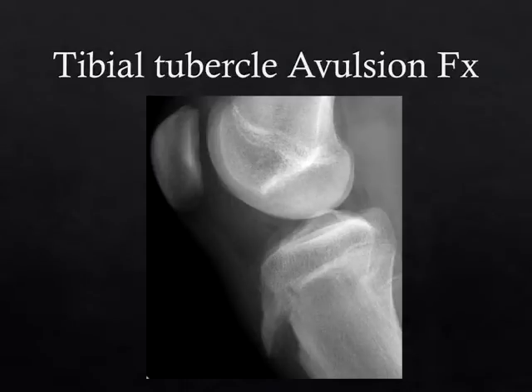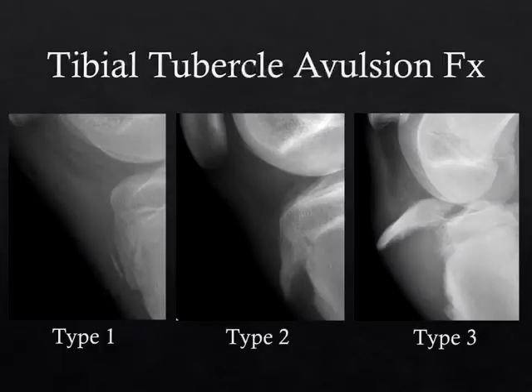And similarly, you can have an acute injury at the tibial tubercle, the avulsion fracture. So again, this is due to forceful contraction of the quadriceps musculature, and basically the patellar tendon remains attached to the tibial tubercle and fractures through the physis, which is, physes in kids are anywhere from 2 to 5 times weaker than the tendons and ligaments, which is why they tend to fracture through their physes rather than develop tendon ruptures, or one of the reasons. So this is a displaced tibial tubercle avulsion fracture.